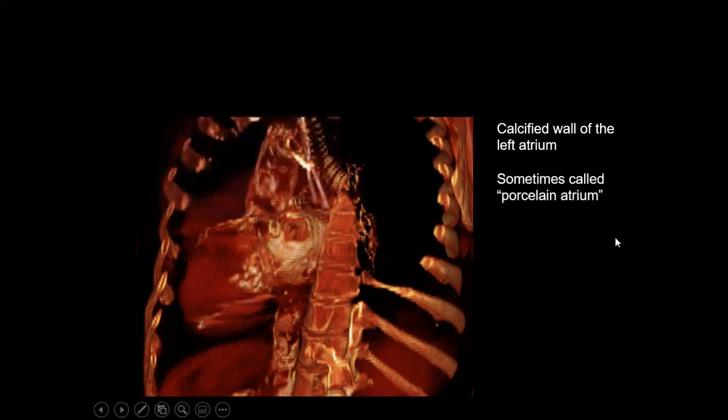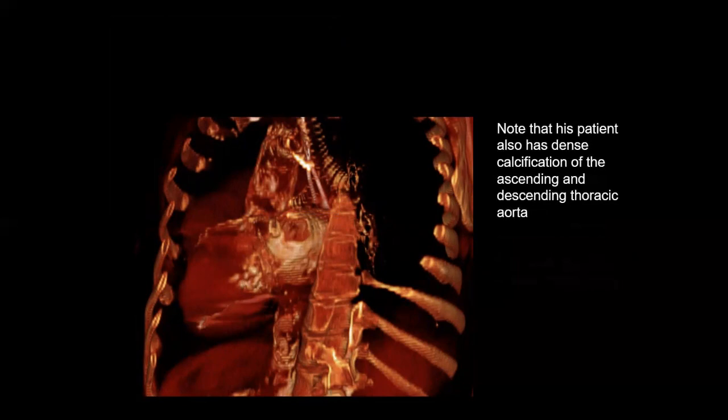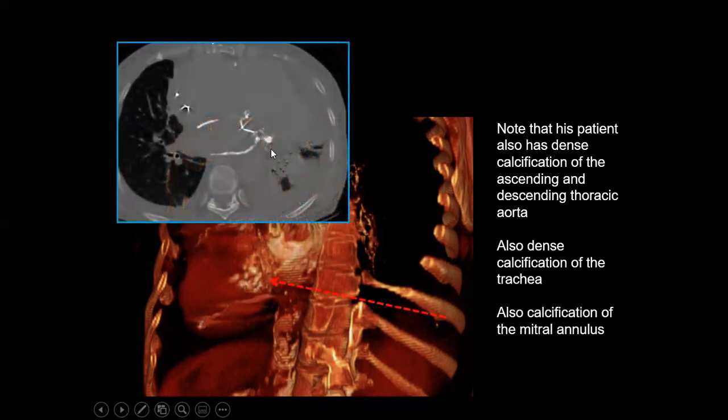This is sometimes called porcelain atrium or coconut atrium. It's most associated with rheumatic heart disease, as in this patient. It's been described as occurring in renal insufficiency. And note this patient also has dense calcification in the ascending aorta and descending thoracic aorta, which I just mentioned. And there's also dense calcifications in the trachea. There's also calcification in the mitral annulus there, which is this stuff, mitral annular calcification.